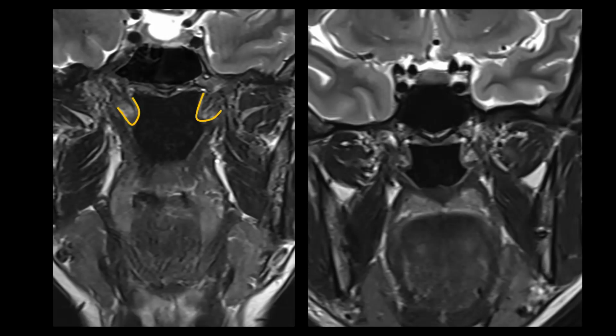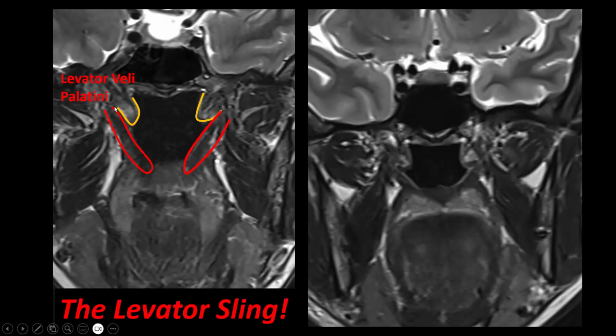So here we have the torus tubarius of the nasopharynx. This is the levator veli palatini muscle, which you remember from the presentation on nasopharyngeal anatomy. And here we see the soft palate. This is another patient, and we see that the levator veli palatini muscles form some kind of sling. So when they contract, they will elevate the soft palate.